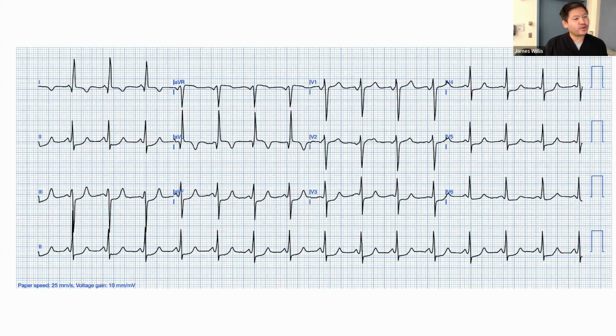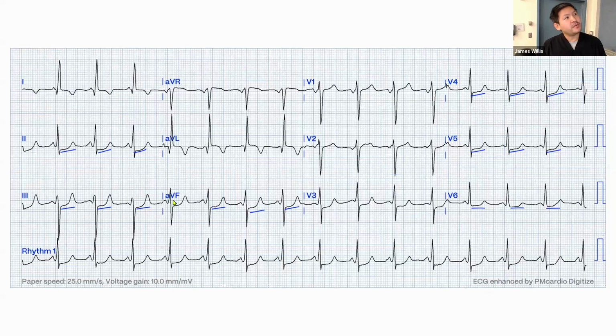Here's another example. I think this is a real case, maybe an NSTEMI case. But here you notice that instead of having curved ST depression, these are all straight and very linear, right? And if you really look closely, maybe there's some aVL elevation, and this is probably a very subtle high lateral MI. I can't remember the cath report, but this was an OMI.